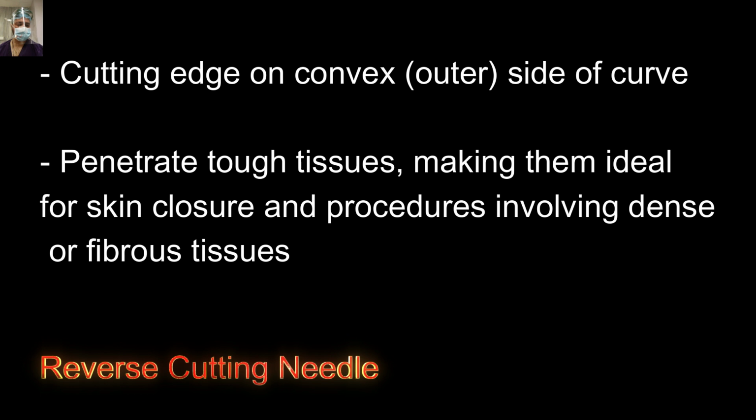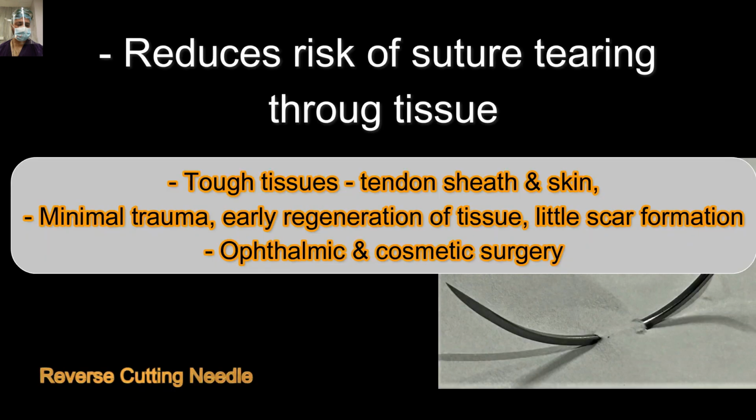Used during the initial part of a surgical career. This is the close-up view of a needle, and basically there's a triangular section of this cutting edge, and it is not the whole length of the needle, only the last part, usually one third, where there is a cutting edge. The rest of the part will be a normal flattened surface.